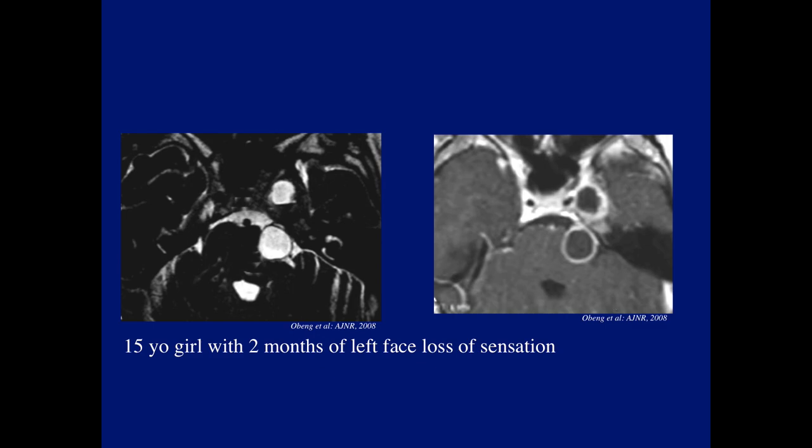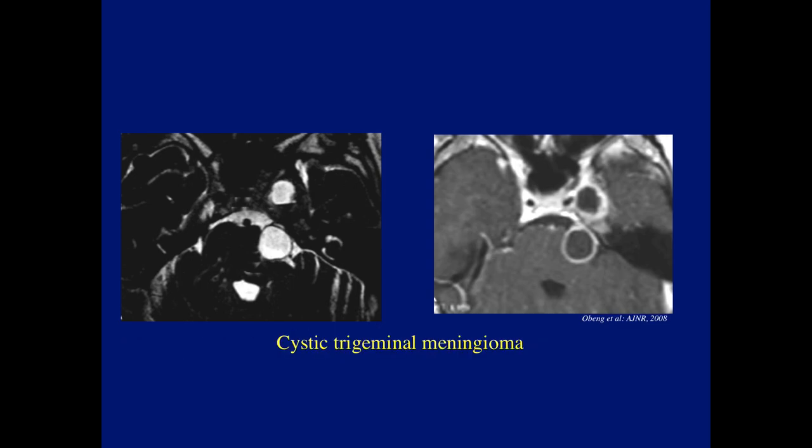It was not a neuroenteric cyst either. Any other common condition, which actually somebody early on mentioned? It was not a glioma. What is left? A common brain tumor. Correct. Eric finally mentioned the magic word. This was a cystic trigeminal meningioma.